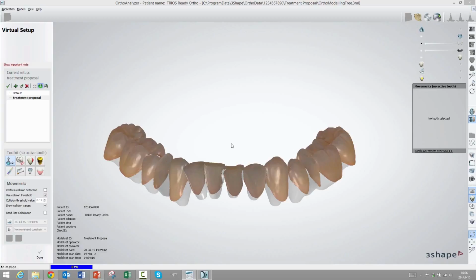And this video is saved into the folder of the patient in our auto data folder. Yeah, as a normal AVI file. Yes. So yeah, it's done now and it's saved.